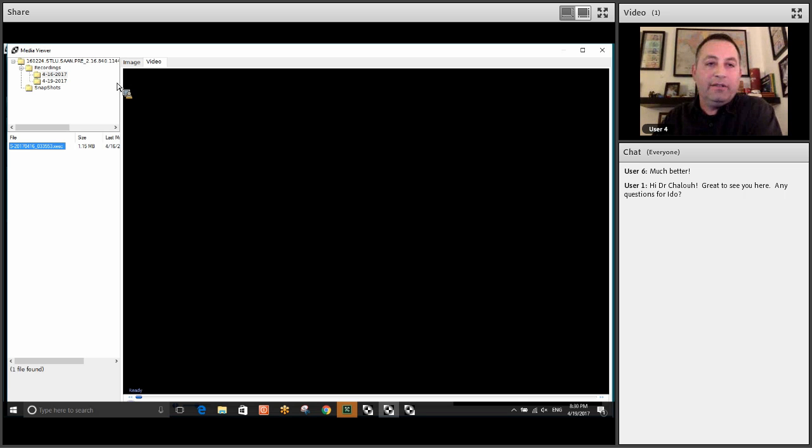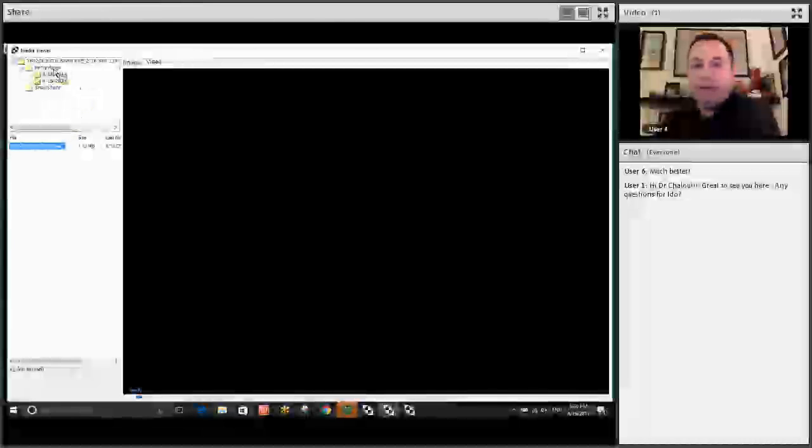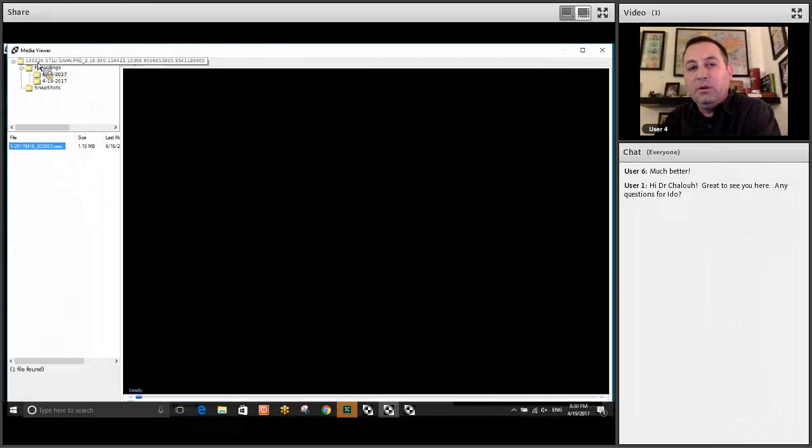Now, the converted file is stored in a folder that is called converted to WMV. It should appear here. In case it doesn't appear, which will happen the first time that you convert for a patient, you simply right-click on the patient's name and hit refresh. Again, refresh. Here. Now we get the converted to WMV folder and we have the converted file.